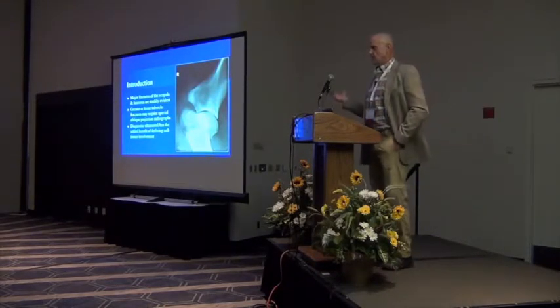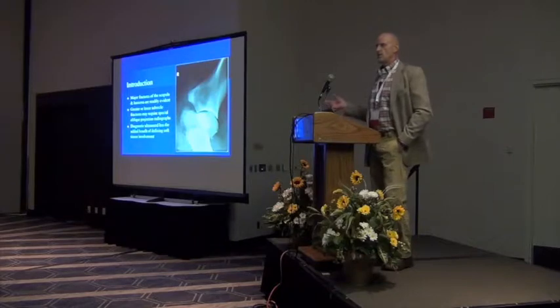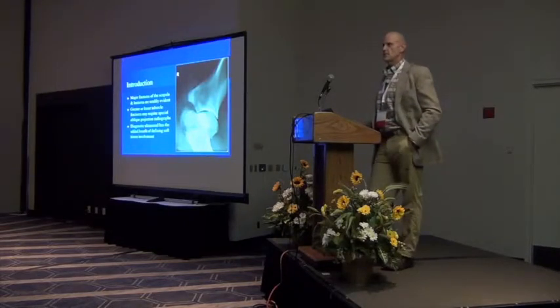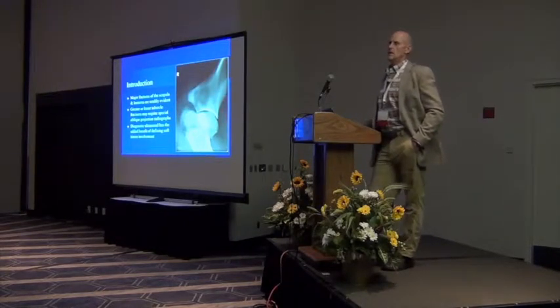And this is a unique case, and I'll show it a little bit later on. This, for all the world, should be a dead horse, right? It doesn't take a rocket scientist to tell that this horse has a significant problem, and as a surgeon, I look at that and think there's not much I'm going to do to fix that. And as it turns out, in over 35 years, I found that some of the clients are smarter than we are.